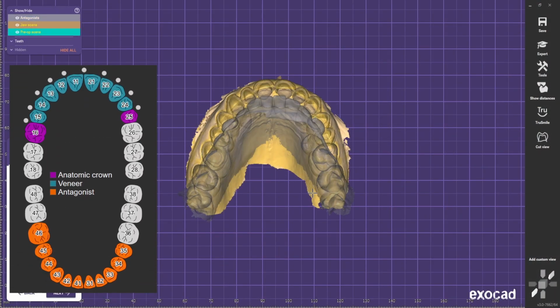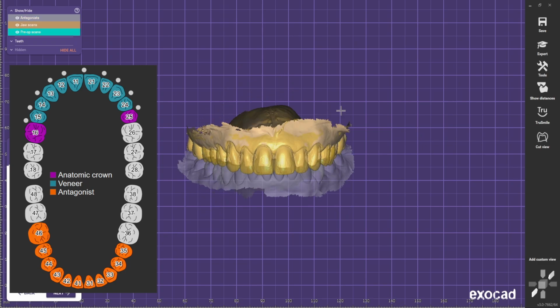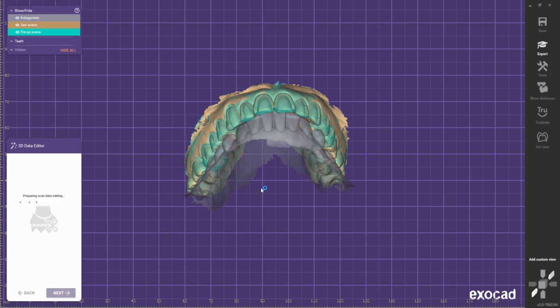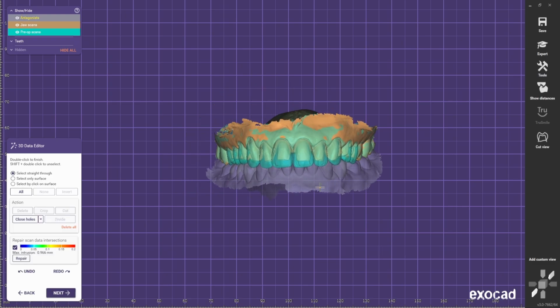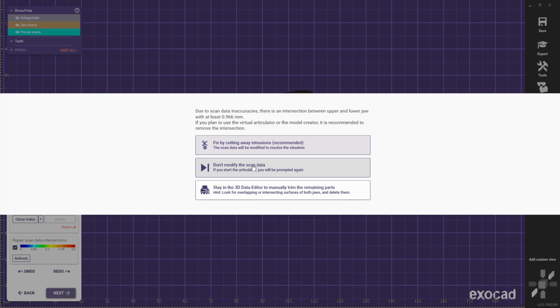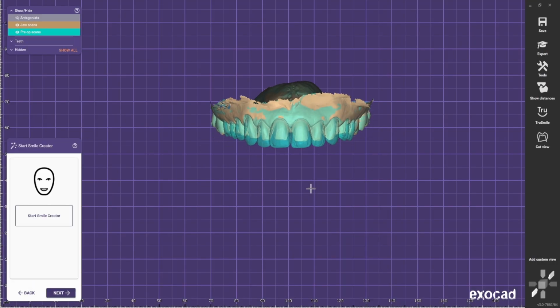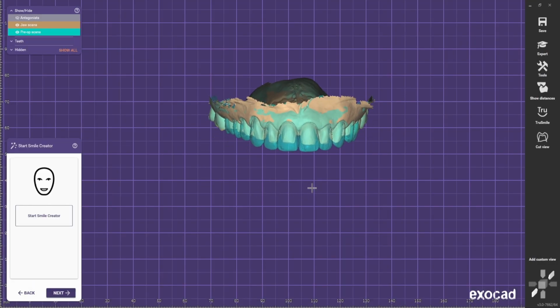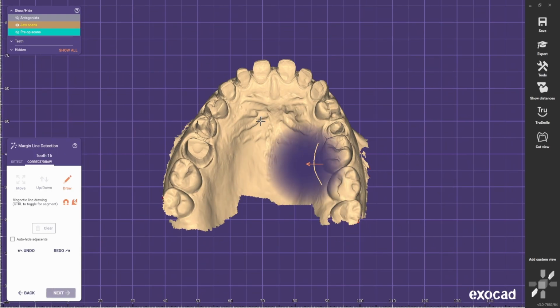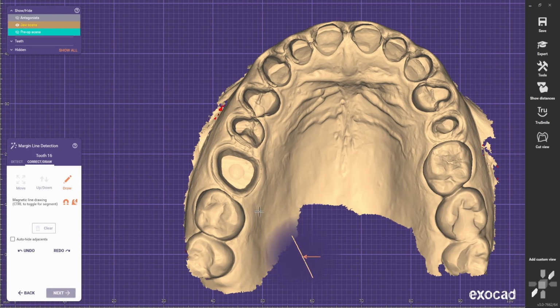Welcome guys, today we are going to design from molar to premolar. It's going to be a full mouth of veneers and 2 crowns. For this case we only have a pre-op to follow. We have no pictures. We're gonna follow roughly the pre-op and we're gonna try to improve on it, shapes and everything we can. So now I'm just gonna set up the margins and I'll be back soon.